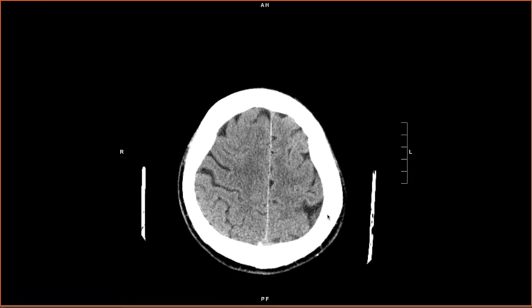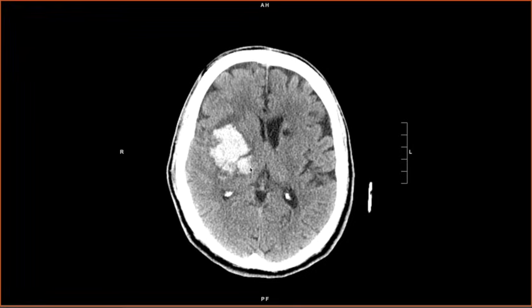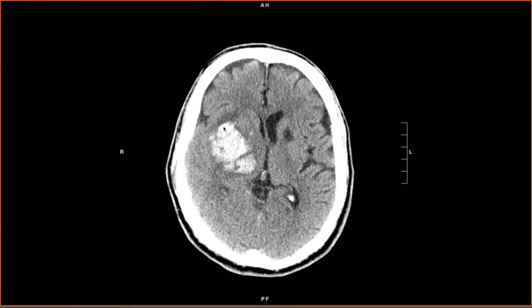We won't do it here for time's sake, but in this case, this is a classic hypertensive hemorrhage. Now, other things can cause blood in this area, but this patient was hypertensive, and we did vascular imaging to make sure there's no vascular malformation. The most common location for a hypertensive hemorrhage is right here.